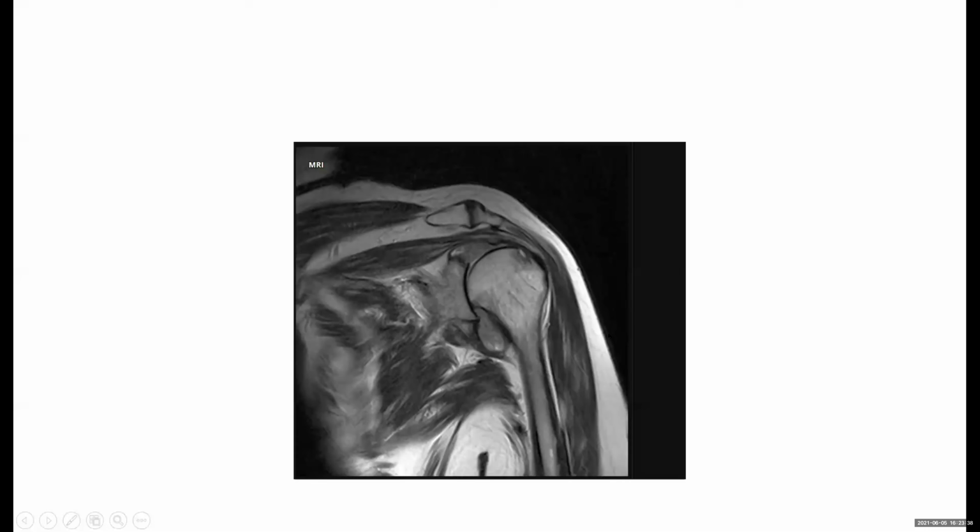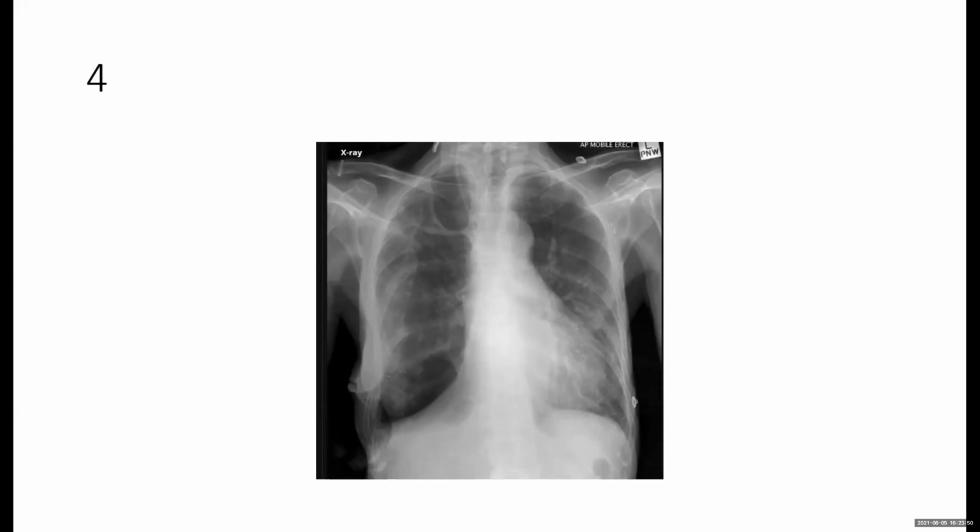Yeah, in T1 weighted images with the fluid, but the fluid intensity looks a little bit bright here. It is T1 weighted images. Oh, wow. Okay, so we'll go to the next case.